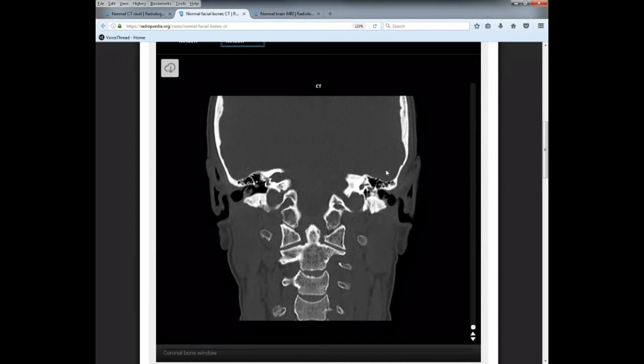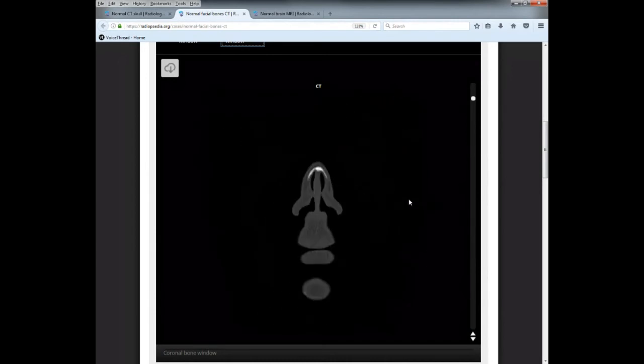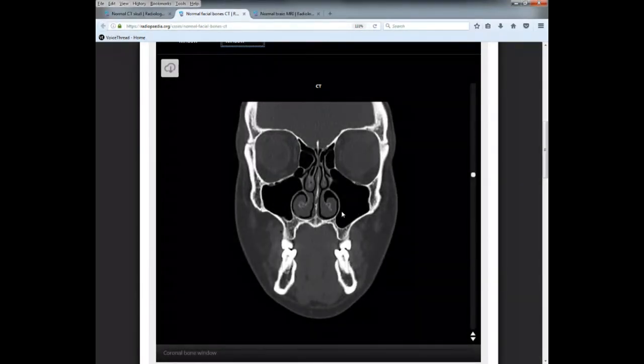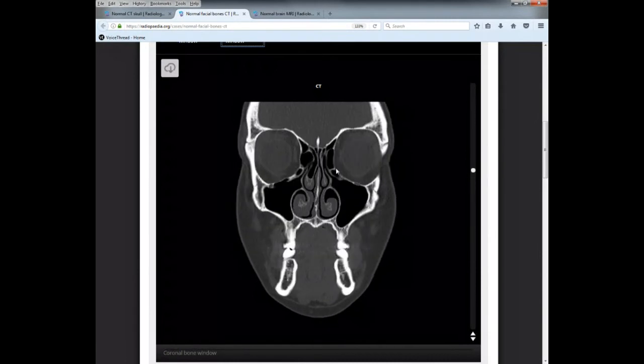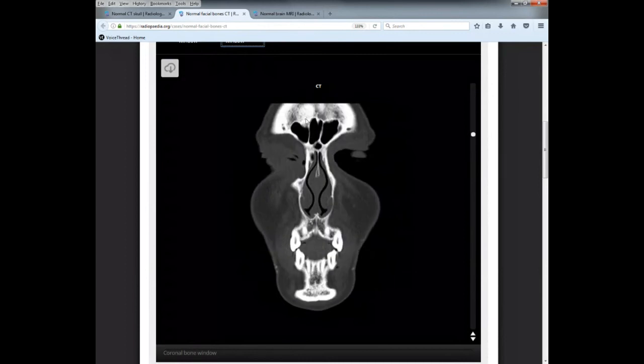And then now we need to talk about sinuses. So traveling all the way anterior, the sinuses that you need to know as well. The maxillary are the easiest right here. Maxillary sinuses. Your frontal sinuses, other easy ones to see right here, frontal sinuses.